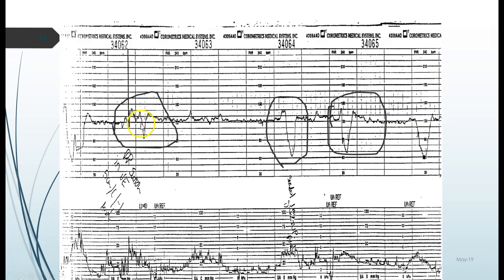So here's some pictures of some variables. There's probably some accels. There's a big whopping variable. So we would document this one. This one dropped down into the 60s, sorry. And so here's some variables. This dropped down to, looks like maybe 50, 60, 70, 80. I can't read those numbers. Okay. And so we're going to document these. These are happening with the contractions.